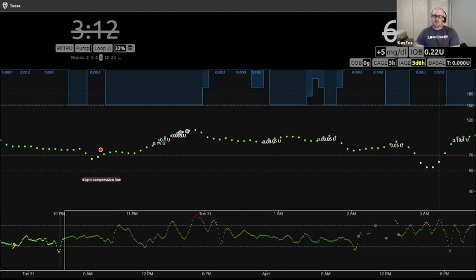Like if you didn't put the cage in the right spot and you don't have the phone available, if you're a caregiver like me, you don't have the phone available or you don't want to go get it to look at when you did the pod change, you can just scroll back to Nightscout and look when these gray dots show up, the suspend and resume activities. And you can say, oh, I threw the cage time somewhere in here. So that's a really quick caregiver tip there.